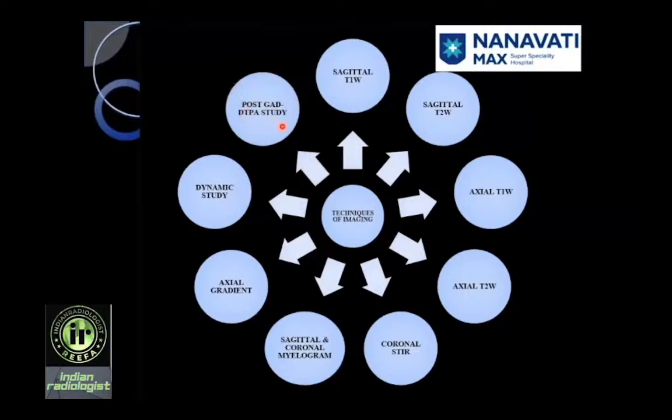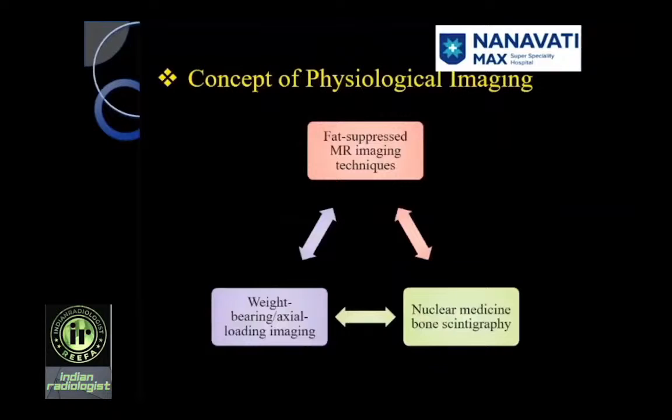Post-contrast study is necessary in the post-operative spine where you're looking for epidural fibrosis or arachnoiditis, and in the immediate post-op period you're looking for hematoma, abscess or discitis osteomyelitis. In that situation, post-contrast fat-suppressed T1 with a slice thickness of 3 or 4 mm is necessary.